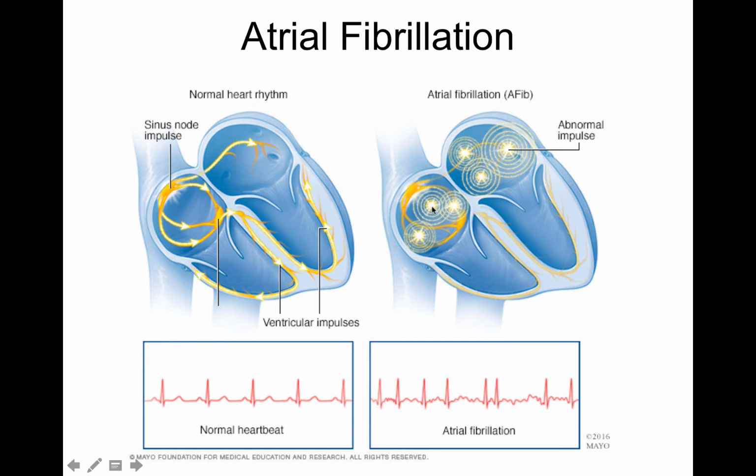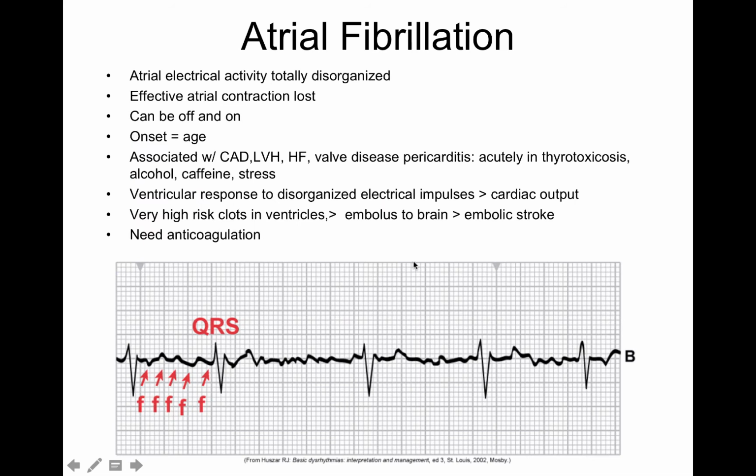And so what you see with atrial fibrillation, we're going to see different P waves because it's from different parts of the atria, and it's not going to be regular. So this can be a subtle thing, where someone just basically wakes up and says, oh my gosh, I just feel like I can't catch my breath and feel like my heart's kind of skipping a beat.